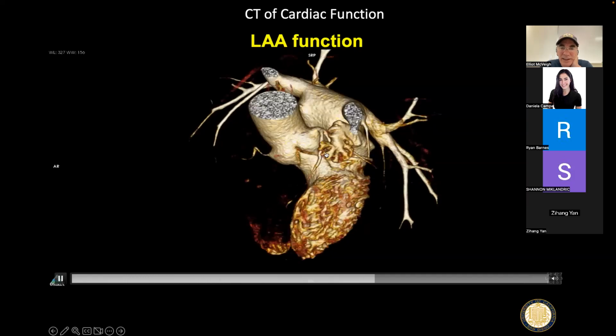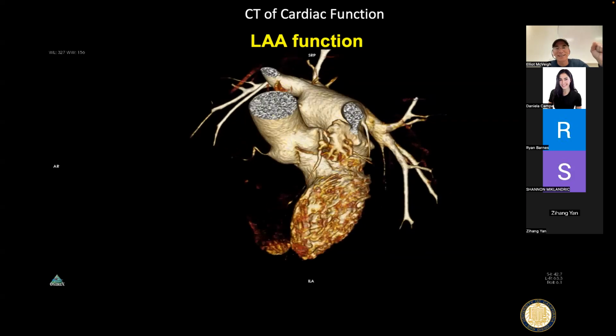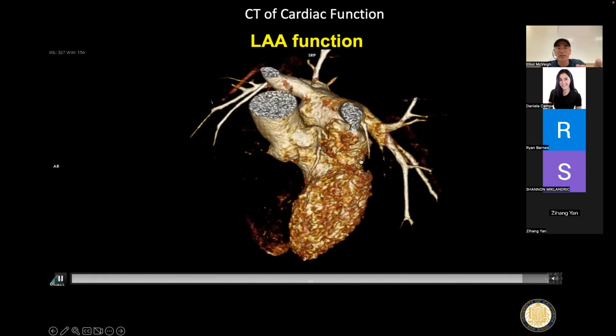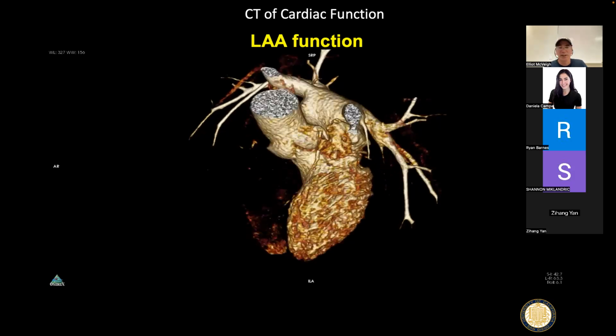And then here is the left atrial appendage, which is like a fantastic little flag that tells you whether or not this atrium is somewhat normal, because the ejection fraction of that little pocket is very high in normal people. So it squishes blood out of this little pocket because you don't want it staying in there in a static way for too long.